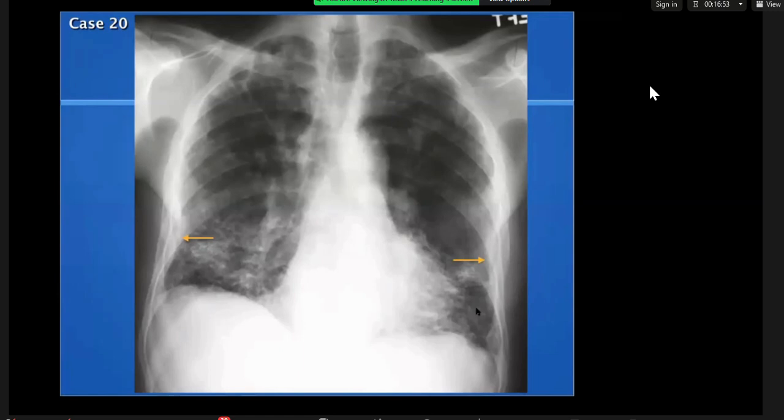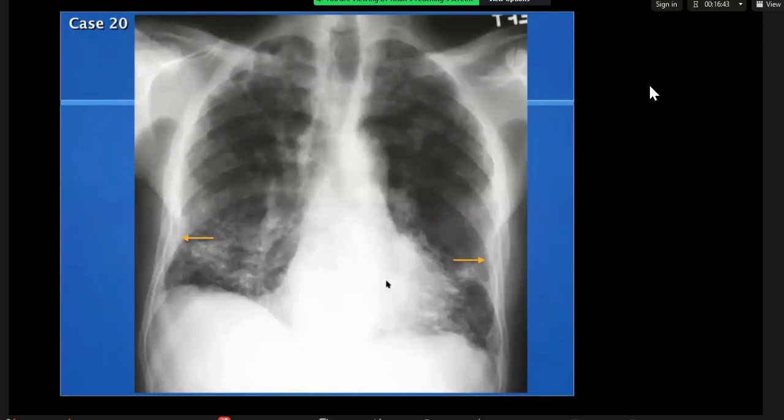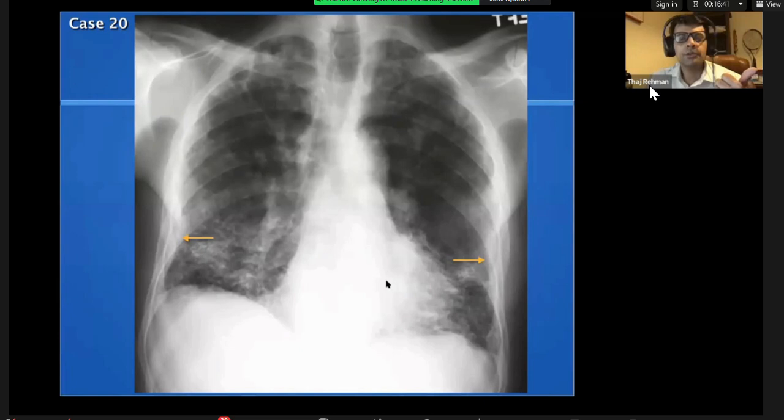Asbestosis. Previous asbestos exposure and asbestosis in the lung. Yeah. When you say asbestosis, that pertains to lung interstitial fibrosis. When you don't see lung interstitial fibrosis, you don't say asbestosis. You say pleural plaques or previous asbestos exposure, manifestations of which can be pleural effusion, pleural thickening, and calcified pleural plaques.